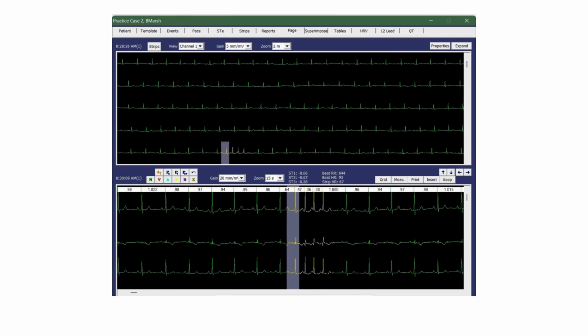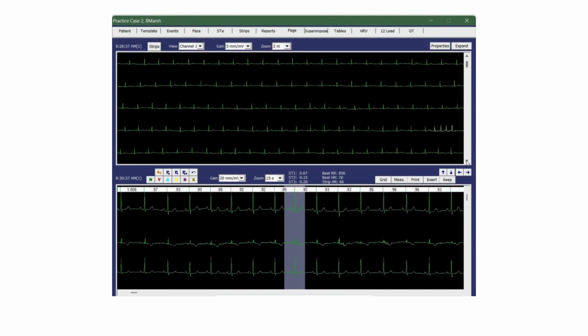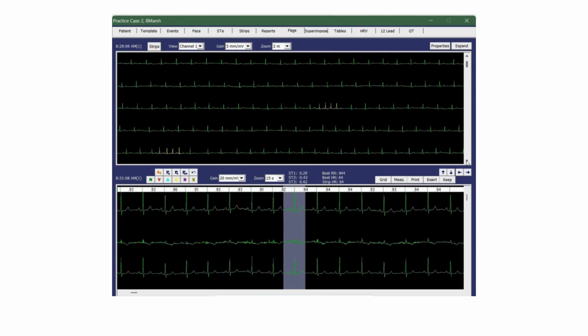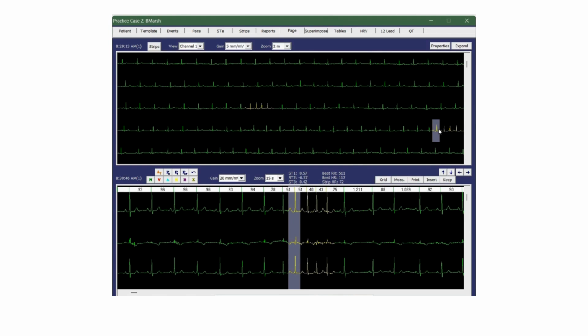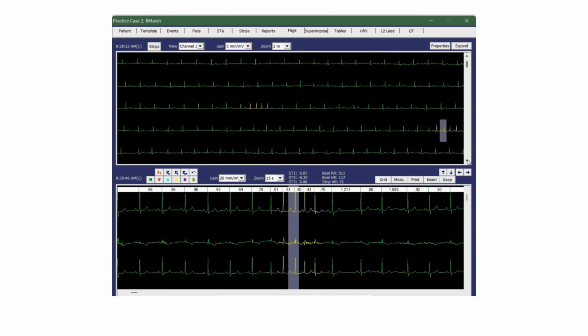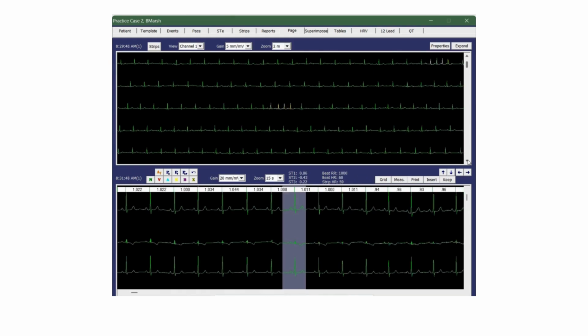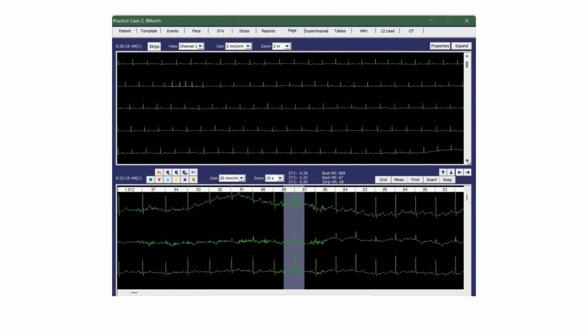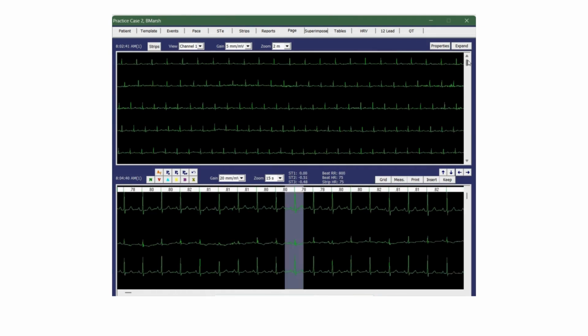So here, at 8:30, there is a run, and I am going to continue to check 5 minutes afterwards just in case there was something more severe. 8:30 again, there is another run. So after I go through, we're down at 8:32, we realize there's nothing else more significant than those SVPB runs.